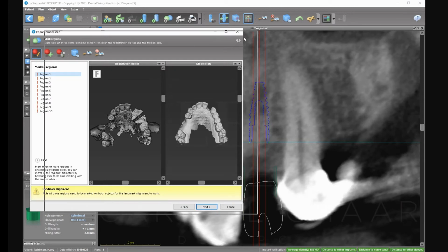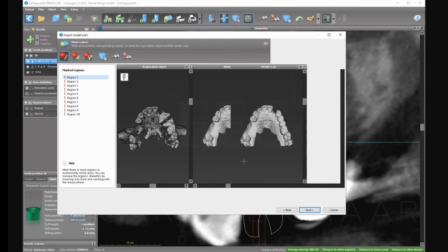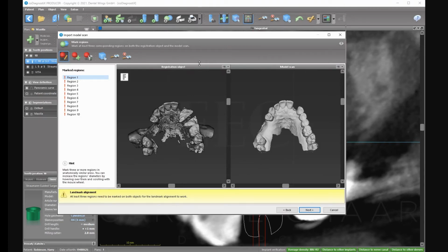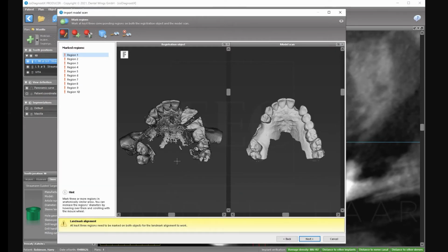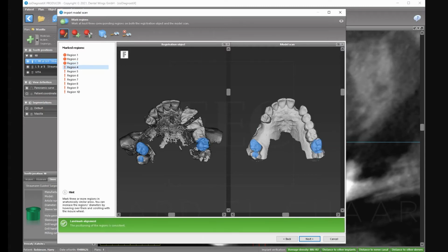Now, if I blow this bigger, then I will lose the screen recording. So I'm going to try to do it within the limit without making it too big. And now I need to merge points to points. So this is a pretty clean DICOM. So I can take this region and I can say boom here, and I make them smaller. It lines up with this. I can do this. They say 3 points. I never listen to that. I like to do more because I think that you need more accuracy in the placement. Okay, I'm going to use this one again.